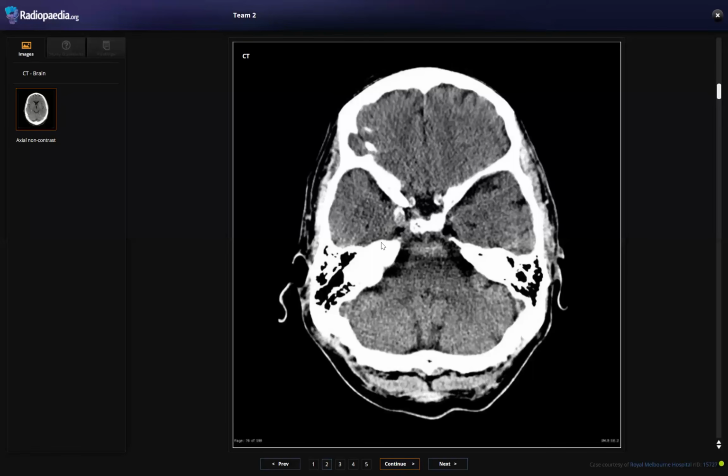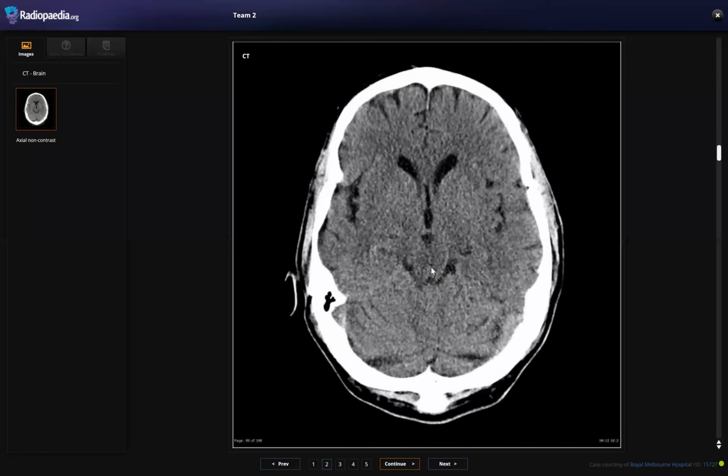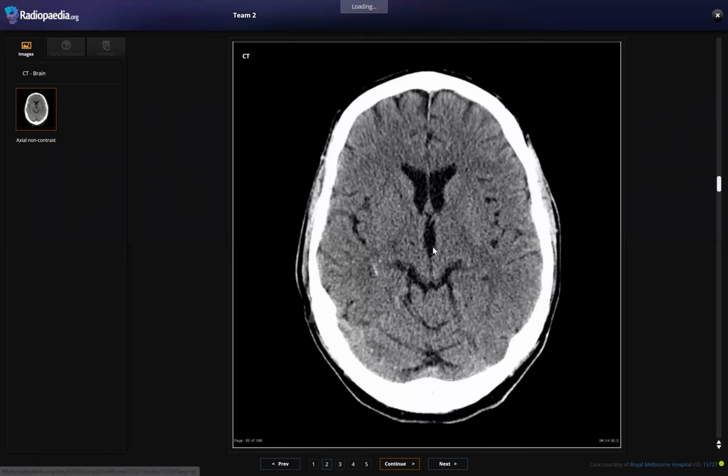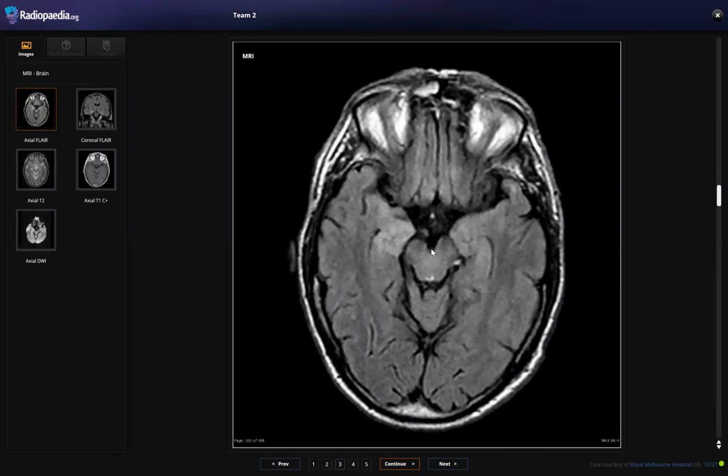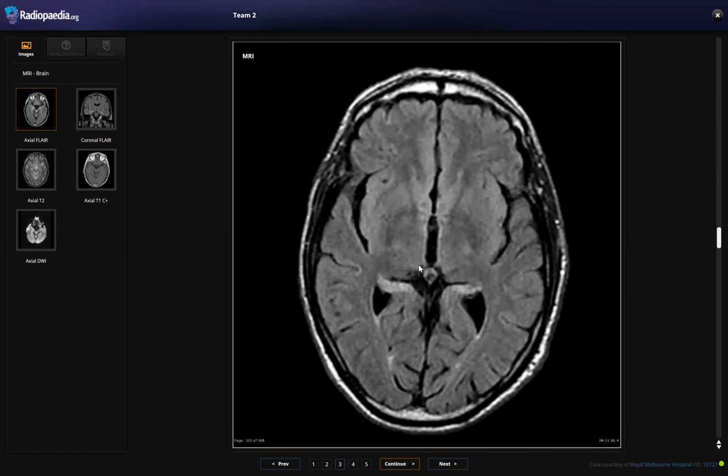There was some. I want to see your approach. I thought it is due to artifact. No, but your approach is good. You mentioned the approach. I put it even though it is normal, but you gave your approach for brain CT reading, which is very good. So you exclude any hemorrhage, hyperdensity. Okay, that's why I put it. And yes, it is a limbic encephalitis or autoimmune encephalitis. Differential is herpes, but herpes is an acute presentation, as you mentioned, and even here the CSF was negative.